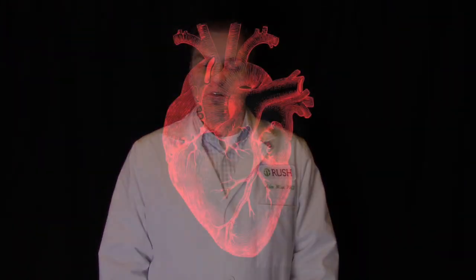Hopefully this demonstration gives you a better appreciation for how to visualize and interpret coronary angiograms. Now it's time to practice and apply these concepts to real angiograms. Good luck as you get to the heart of your studies.